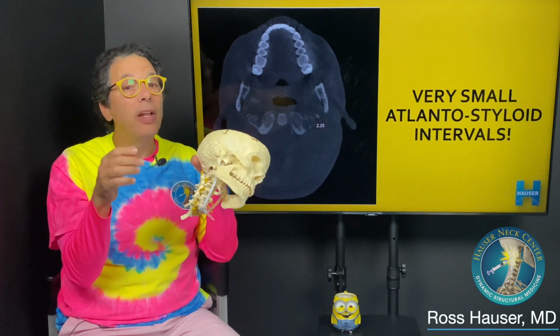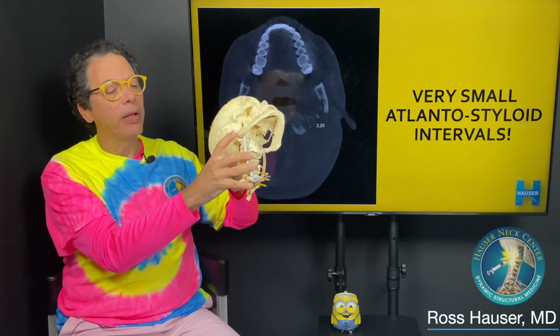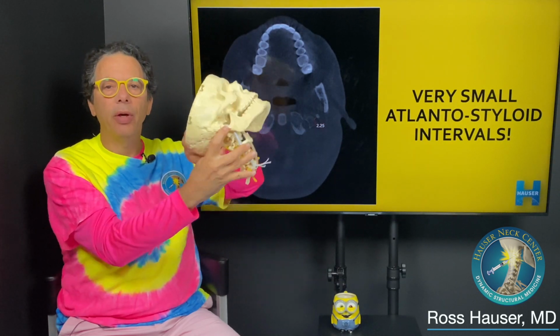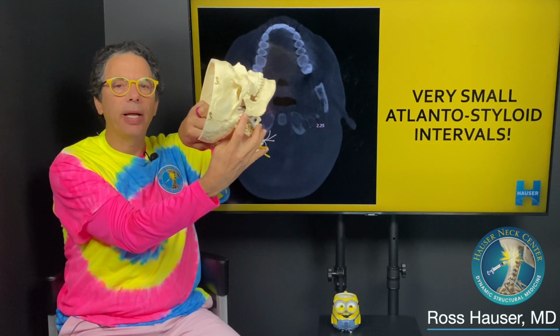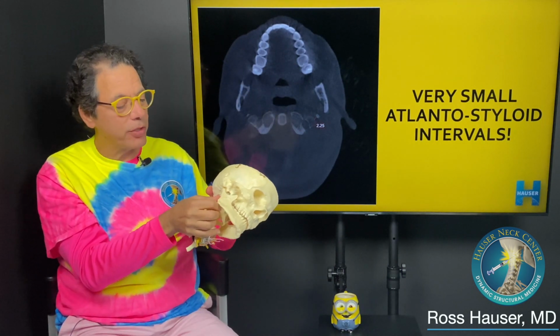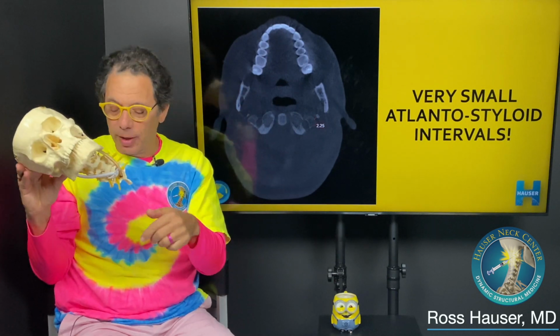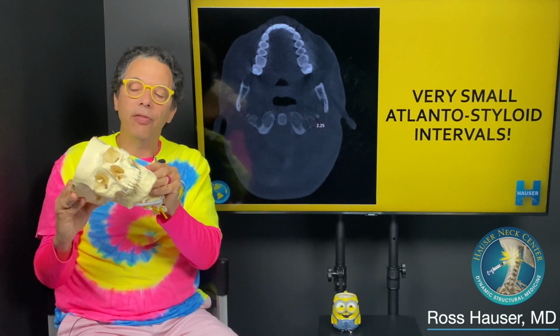The jugular vein specifically goes between the atlas and this bone called the styloid bone. So you see in Eddie, there's a styloid bone. Well, I just fractured Eddie's styloid bone. Wow, that was cool. Here, we're going to go to the other side. So actually I'm going to have to repair Eddie's styloid bone.